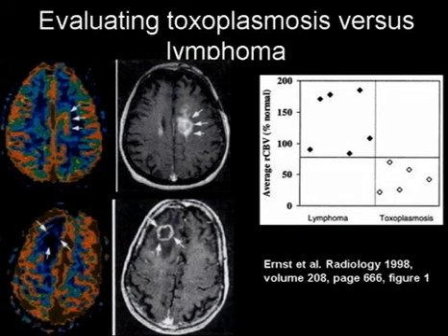And so one of the things is how do we go ahead and evaluate this? Some people have used thallium SPECT, some people use FDG PET. Another way to go about doing this is to use MR perfusion and the increased vascularity of the neoplastic disease to help us sort out what's going to be lymphoma. As we can see here, it manifests as increased color on the color map, and then toxoplasmosis, which is almost like a form of abscess, we've got decrement and devascularity associated with this lesion.